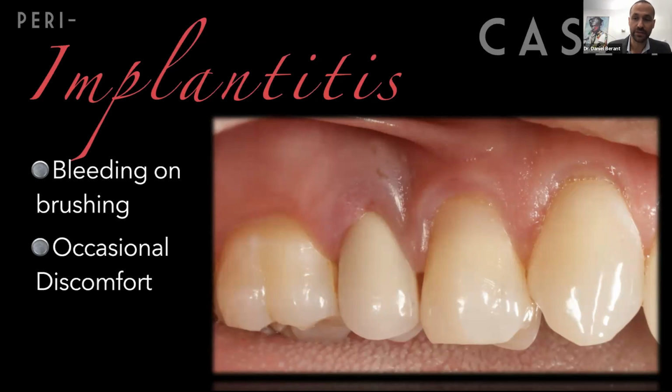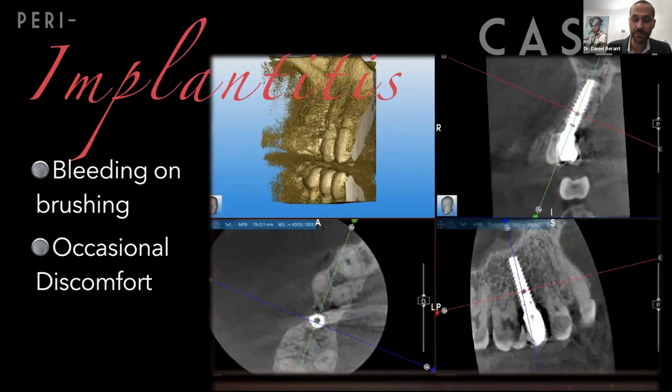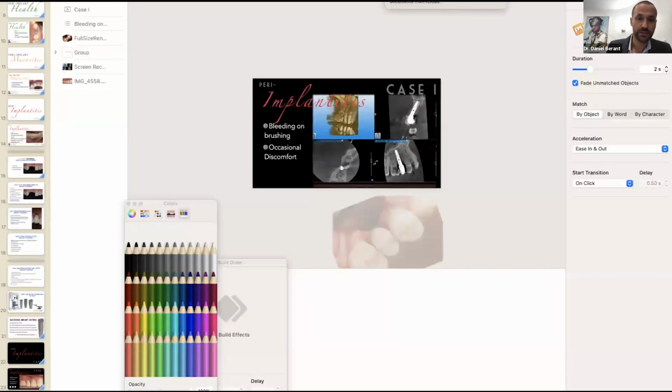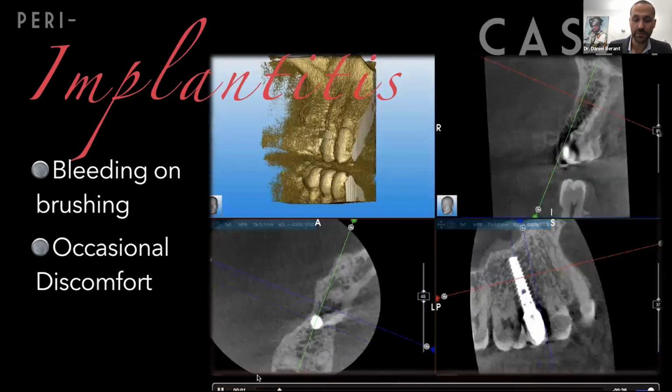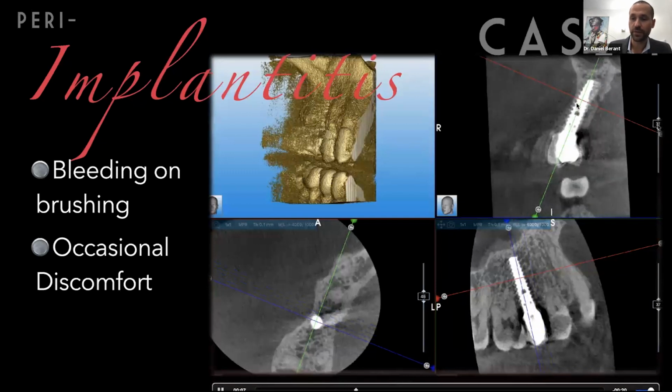Well, after we get the medical dental history, we take a PA, which doesn't show any signs of bone loss. But when we take a CBCT, sorry, 1 second. Let me go back to that CBCT. When we go back to the CBCT and start scrolling, I don't know if you can see my mouse, but at the top right corner, we start seeing the lack of bone up to 5 threads on the implant surface.